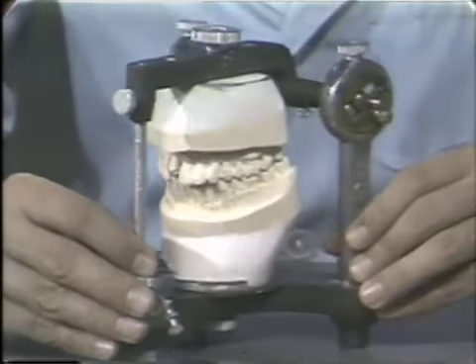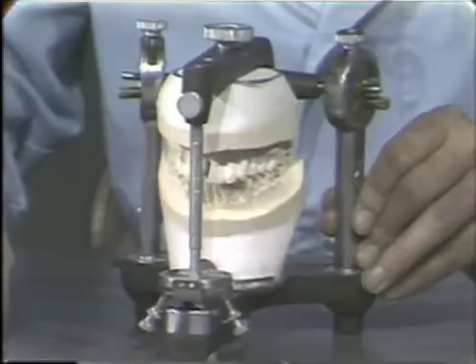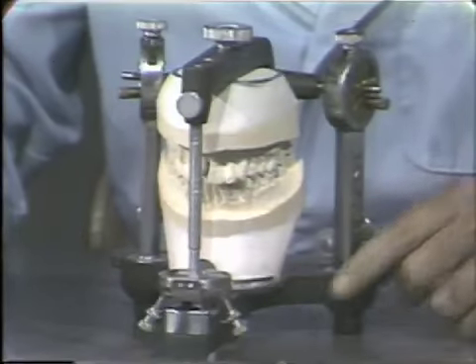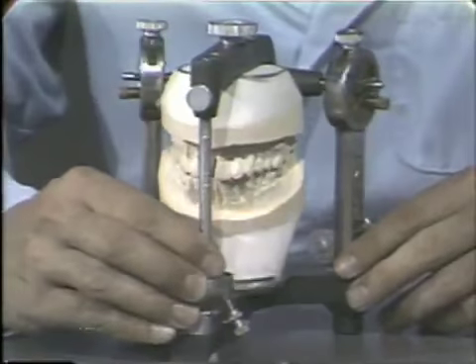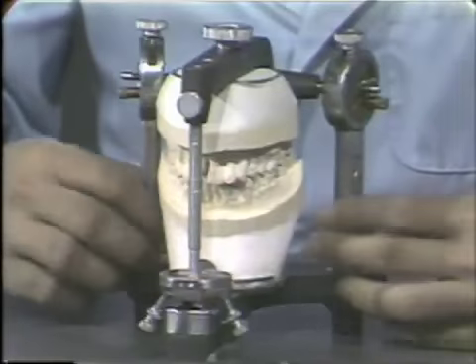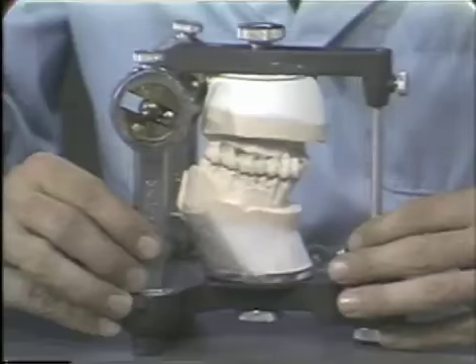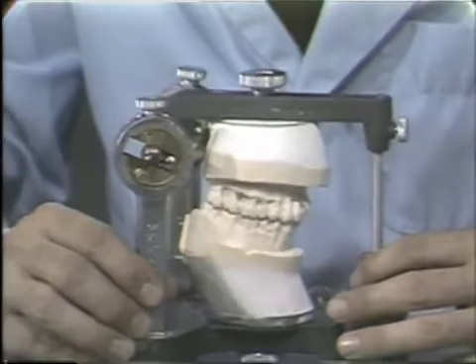Now we want to show, on sort of an oblique angle, that this vertical axis is set medially. You can see that it is set to the inner aspect to simulate that downward and inward movement on the skull. So let's go back to the hinge movement and show, with a split screen, the corresponding movements of the skull.